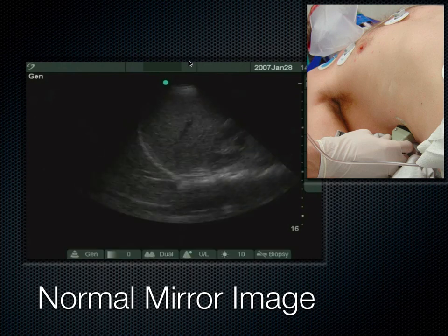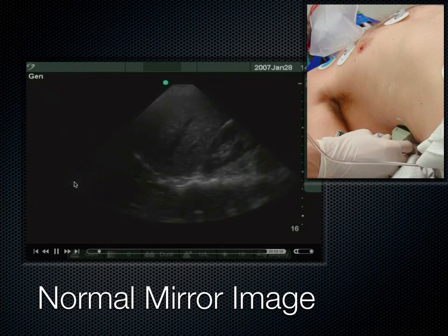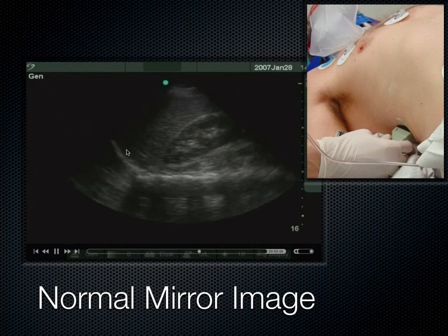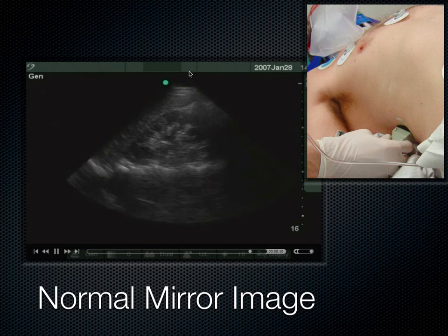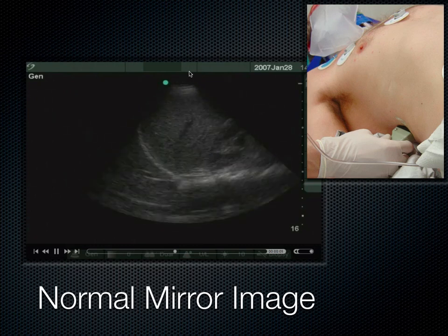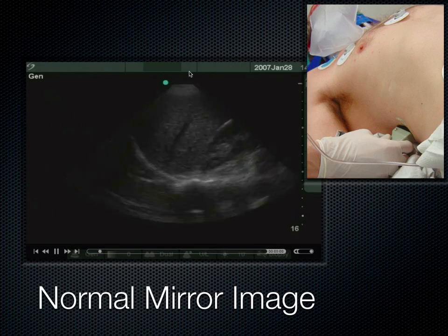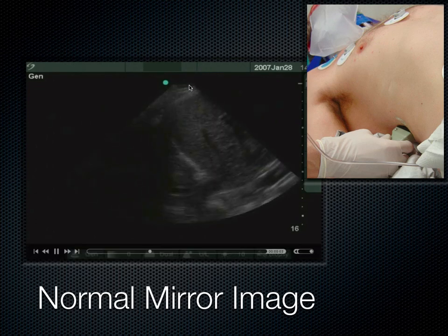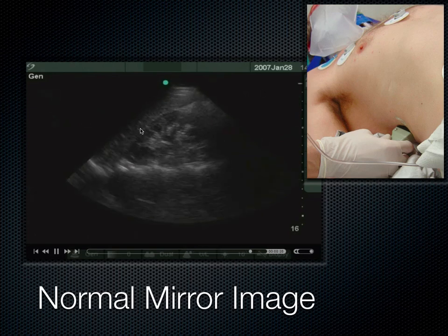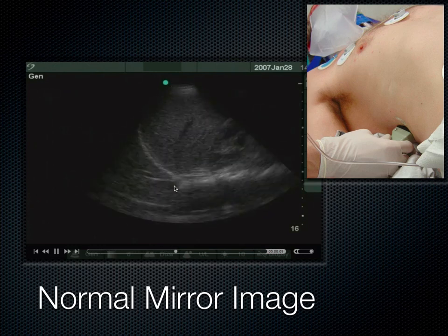What happens is ultrasound waves come and glance or hit the diaphragm, and they cannot go through the diaphragm if there's air on the other side. They cannot be transmitted. So those waves will basically skate along the diaphragm and come back up to the probe in a delayed fashion. And because to the probe, to the machine, time is distance, time is depth, then that delayed signal coming back through the liver appears as if there's liver deeper on the image. So if you can imagine this ultrasound beam coming through, skating off, coming back up to the probe, and the probe thinking, oh, that looks like liver, but it looks like it's down here, then you end up seeing what looks like liver on the other side, and you can even see the vessels and everything else.